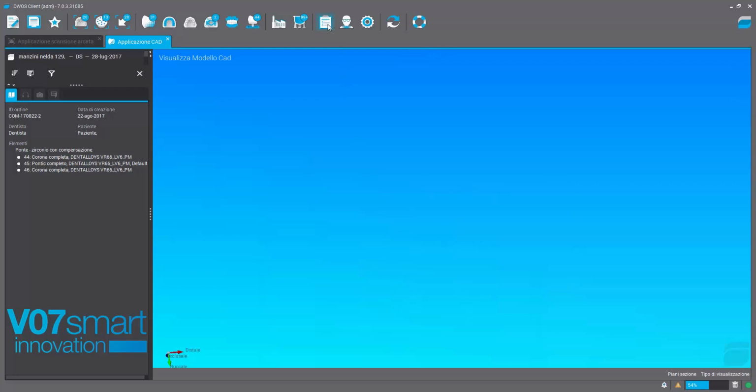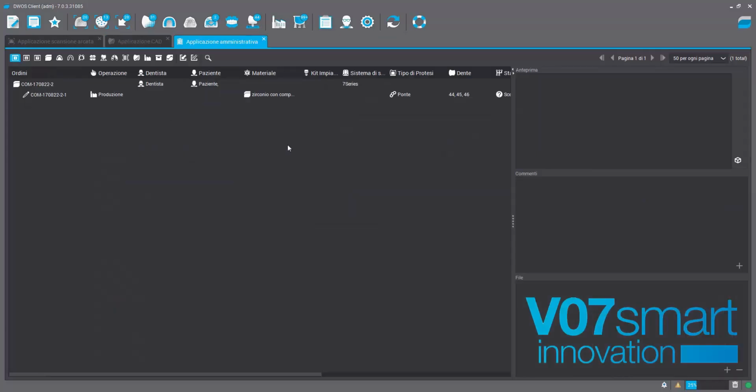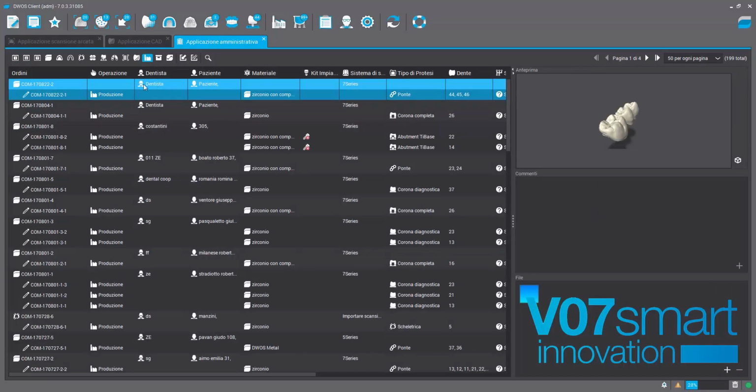Click on the white small folder that concerns the order management. Among the filters, click on the little factory so the first order we find is the last one we saved.